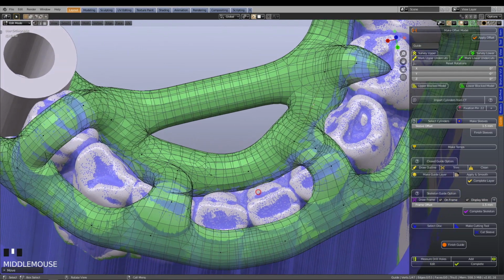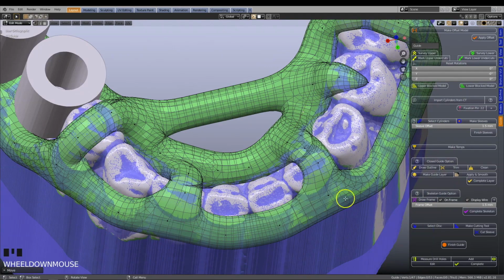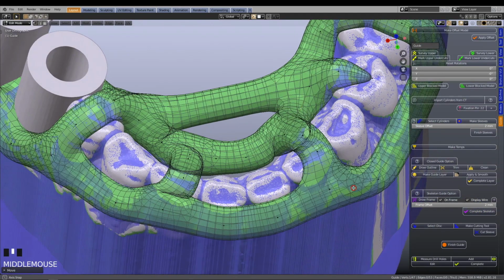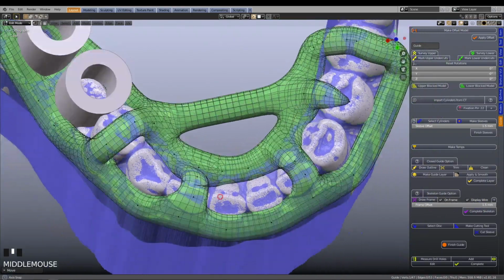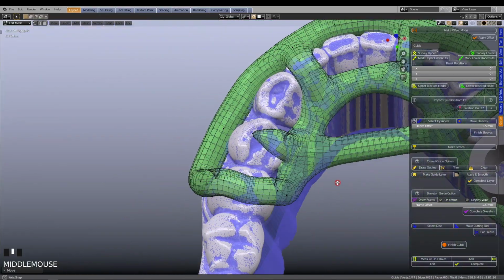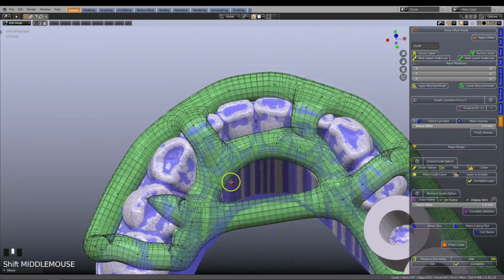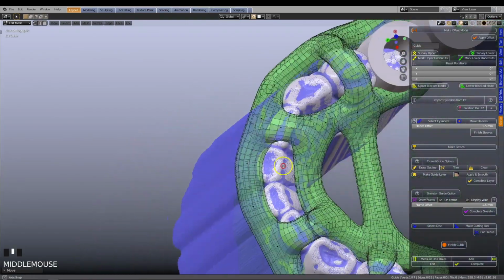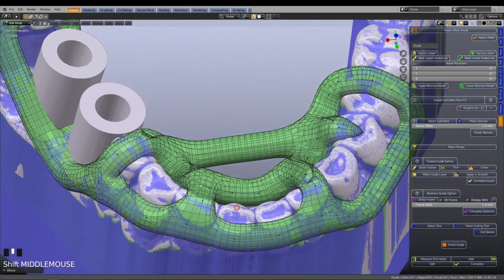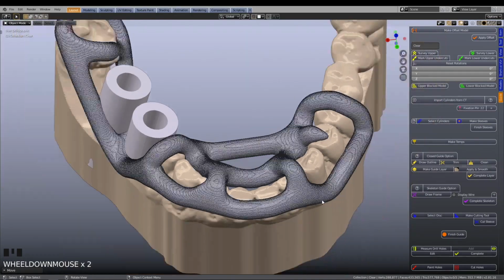If you need to increase the contacting areas, you can use the frame offset slider bar on the menu. By entering a new value, or by moving the slider, you can move the frame closer to the model. After this, we can solidify the guide. Navigate back to the menu, and press on the Complete Skeleton tab. This action will remesh the entire structure into a brand new mesh.